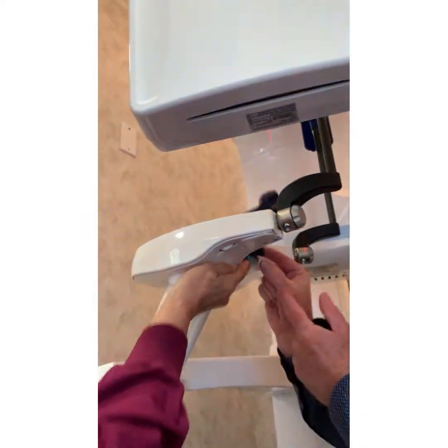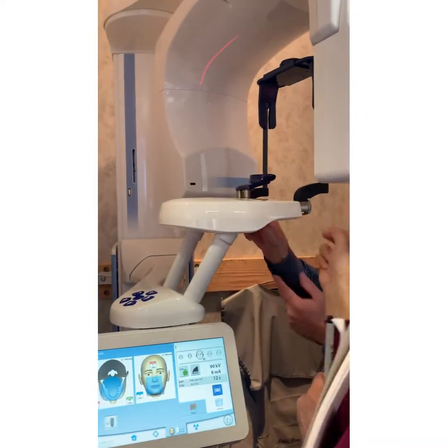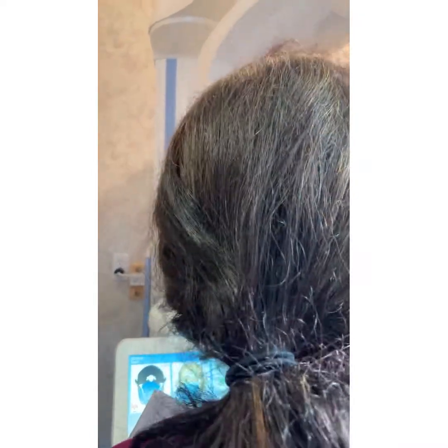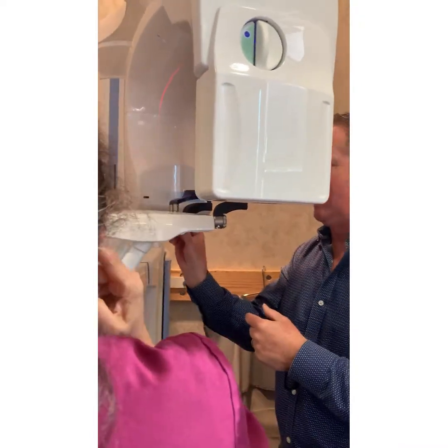And there's like a little button down there. You want it under the jaw, so let me... You get a little spring, right? Yep, this right here just pulls out. See this right here? This right here just pulls out. Oh, this guy. Okay. Hold on, we're not done training yet. This just pulls out, and this spring pulls out and allows you to adjust that. Correct.